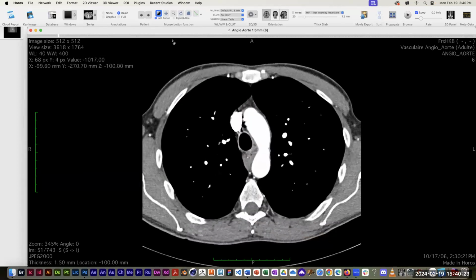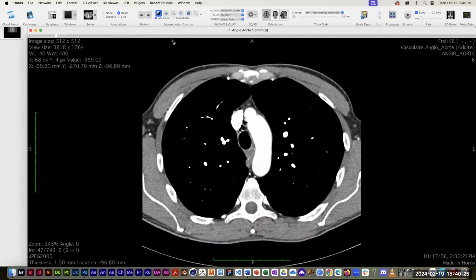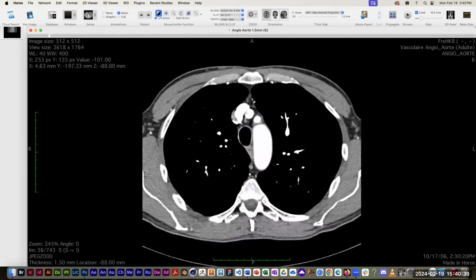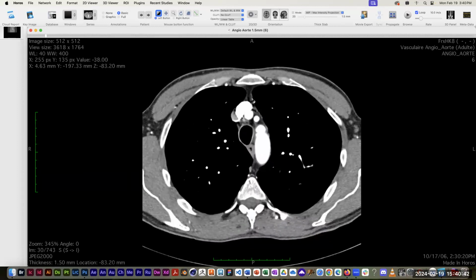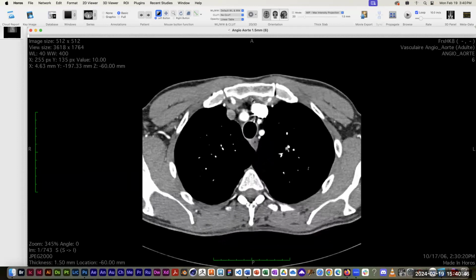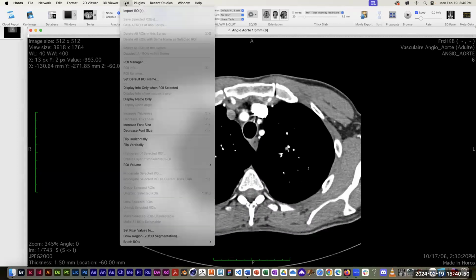Okay, maybe if I click on one of these, I mean, the lungs are supposed to be completely separate, right? They are separated by a pleura, so they shouldn't be joined. But I just know when I've done this on my own a couple of times, it always seems to get both lungs right off the bat. So maybe I need one of these where it looks like they're touching. It looks like they're continuous. So let's try that again.